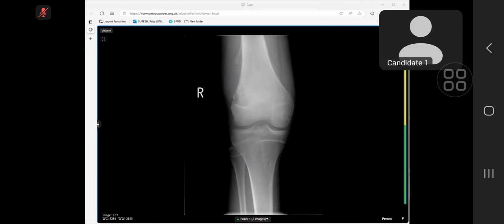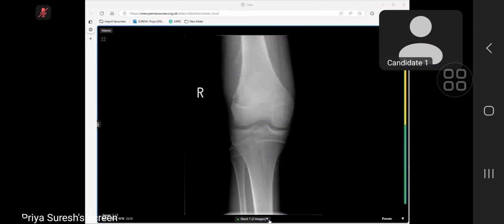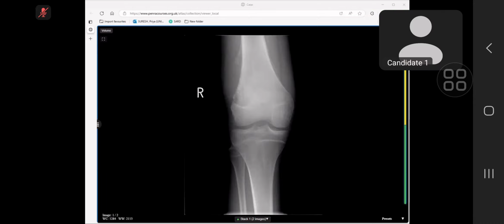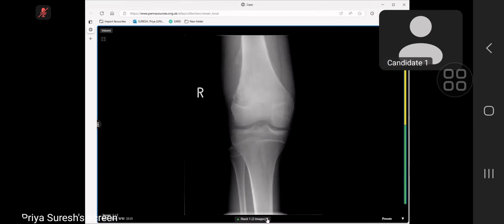Less likely possibility is Ewing sarcoma because it is mostly permeative and lucent in appearance. I would recommend MR whole limb with contrast for further evaluation and local staging of this tumor. Okay. In your normal practice, do you do it? I would see the previous images and the contralateral limb. Okay. So what imaging do you want to do next? MRI with contrast.